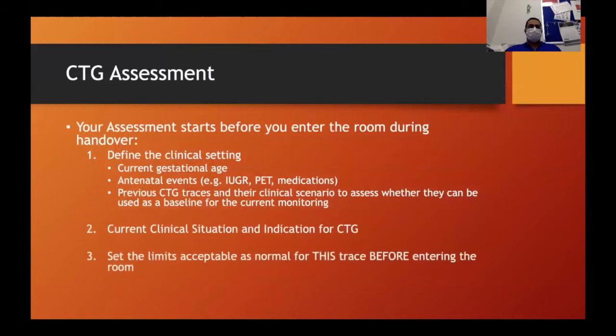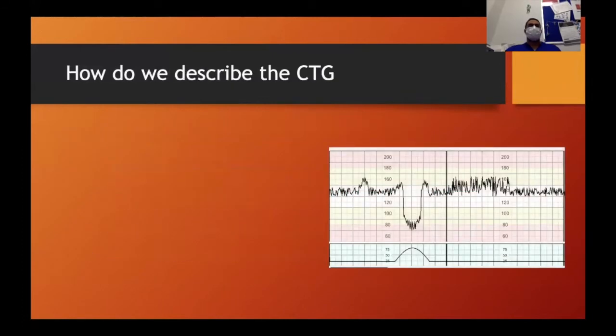Before we carry on with that, let's ask again, because everybody talks about expecting the baseline to be something. You just said you're expecting the baseline to be 140. What is the baseline? How do you describe a baseline? Contractions are easy: the bell-shaped curve on the TOCO. But talking about the baby's features, what's the baseline?